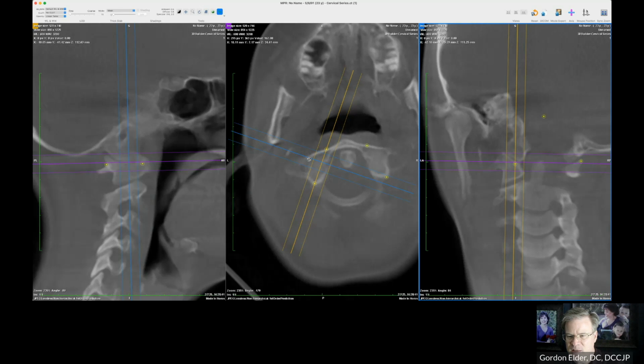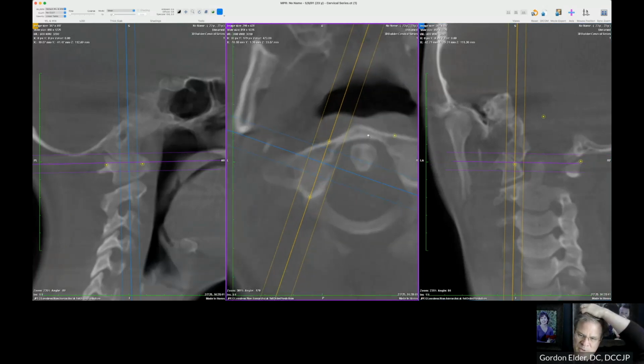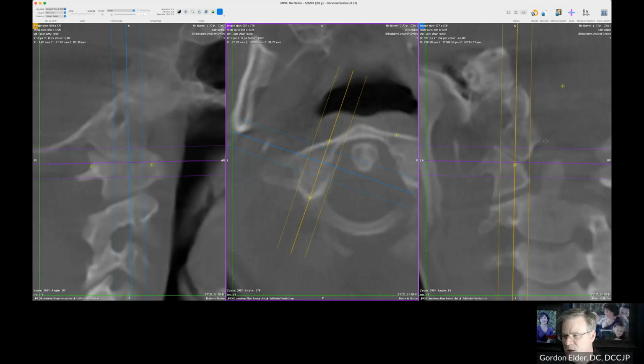That would be here. And so this is actually the anterolateral, but some people, this is also anterolateral. And this, he determined, was not a good spot because as the joint rolls forward, back and forth in life, the front of the joints don't mirror image. They don't line up in a lot of people, not consistently enough for us to use it. So if you're coming around that front lateral margin, you often will see an overlap when in reality it may be lined up. So we come to that part there where I want to look at it through the thickest part.